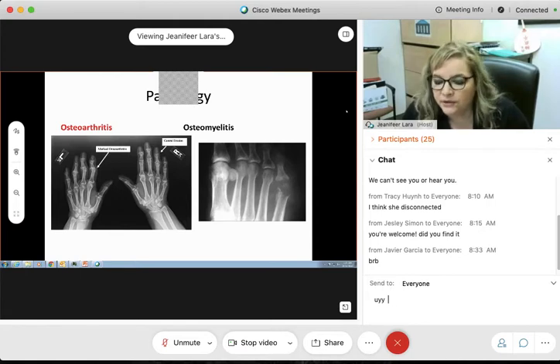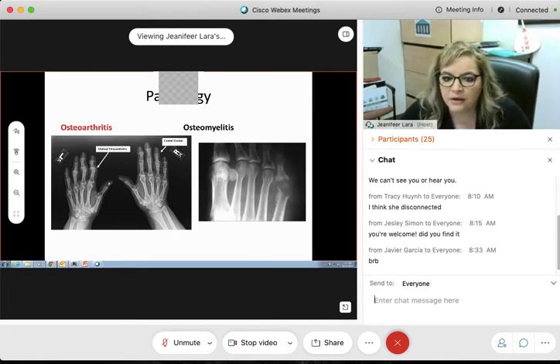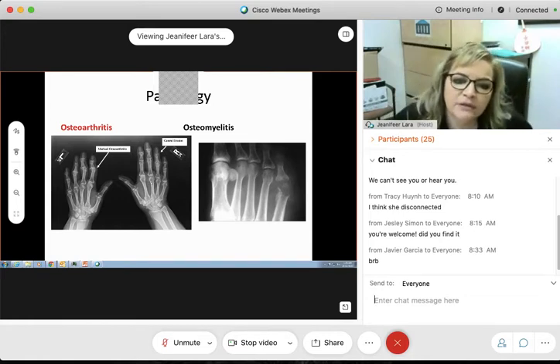Degenerative basically means that as we age and live a long life, our bodies are going to start eroding. Our calcium supplies will start to decline. So osteoarthritis is basically starting to mark those types of erosions. Let's take a look at this image over here to the left.